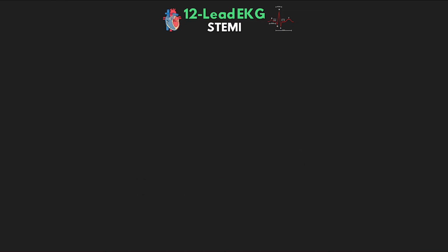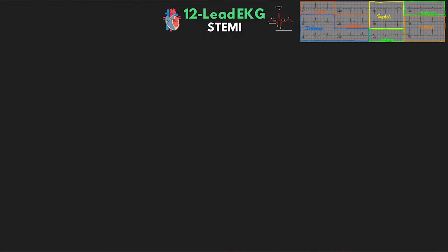Okay, now that we have all that information covered and out of the way, let's start to look at some EKGs of STEMIs in different regions of the heart. And to help with the identification, I am going to keep this chart up top, kind of showing our infarcted regions. All right, so let's start off looking at our inferior wall. So remember, this is seen with leads 2, 3, and AVF, and is typically perfused in 90% of people by the RCA, and the other 10% by the circumflex.